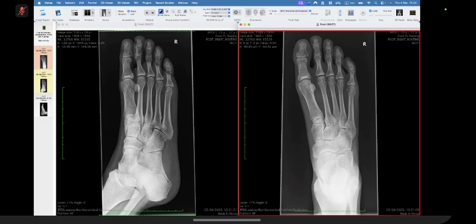No, it's not a cuboid lytic lesion. This is a rare case of an absent medial sesamoid. I have never seen it before. I just find it very interesting. This is congenital. It's an incidental finding in this patient. All right, any questions? The forum is open. If you guys have any questions, I'm happy to answer.